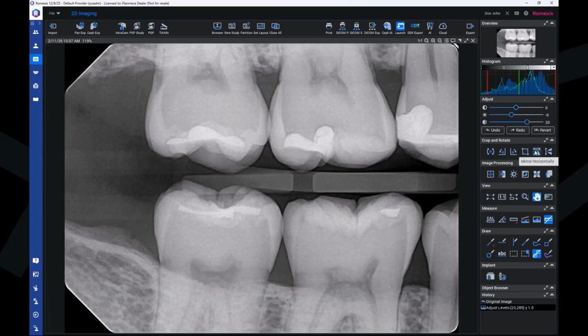images. So these, of course, if you are not using the AI for the recognition of the tooth numbers and the automatic rotation of the images per tooth number, then you might need to use these manual mirroring tools.